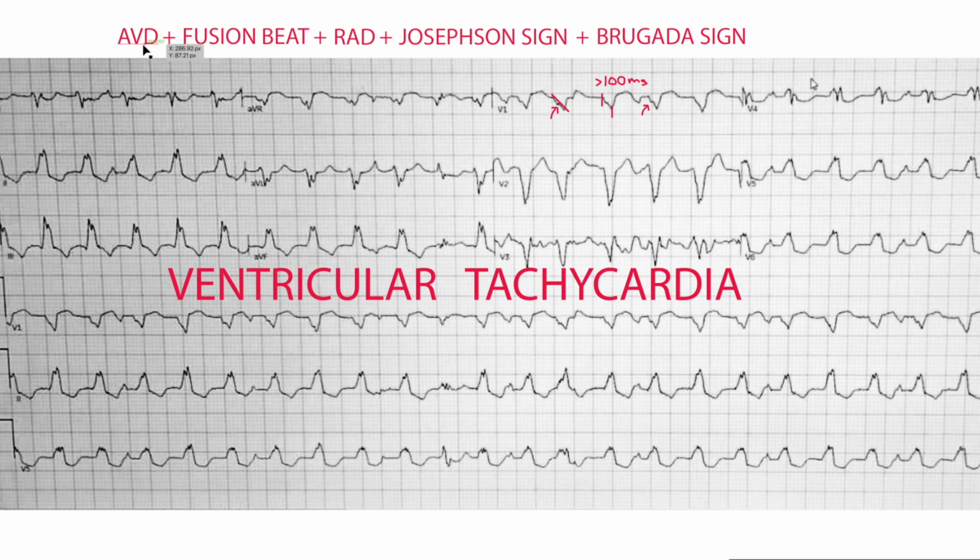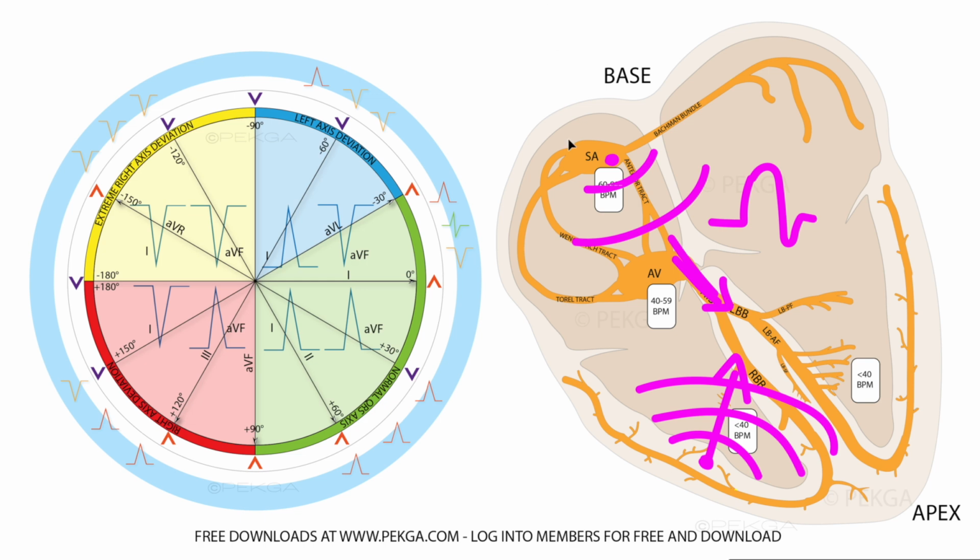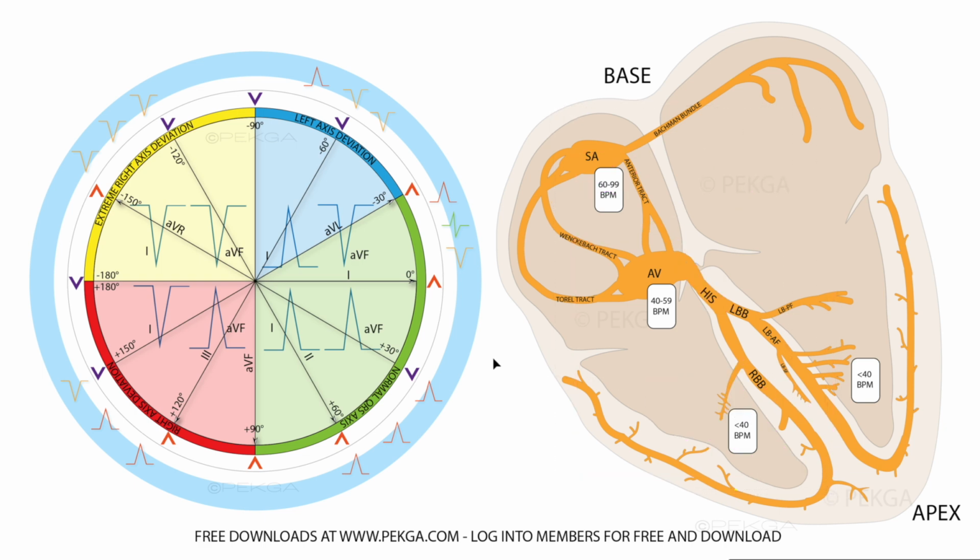The information up here supports the conclusion of ventricular tachycardia. And what is ventricular tachycardia? That's something to address before we part ways today here. So, ventricular tachycardia, I'm just going to get rid of this.